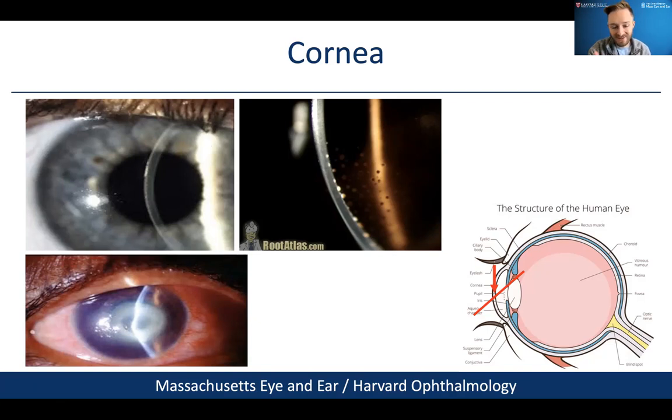useful. For example, in the bottom picture, we see a corneal ulcer. It looks devastating. It's nice and soupy white, infected, but what you can see is that at the top and the bottom, you see the nice epithelium, stroma, and endothelium. But what happens when we get to this, the ulcer? Unfortunately, the ulcer has caused thinning of the cornea, and we see that instead of being bowed out like a healthy cornea, it's actually diving in, and it has a depression in the center of the ulcer. Corneal ulcers, if they get bad enough, can actually thin so much that they perforate the eye, and the intraocular contents can leak outside. And so these are emergencies and need to be treated immediately.